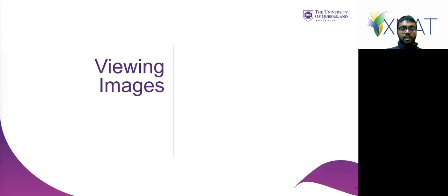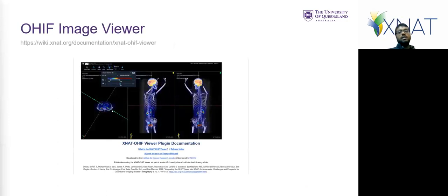Okay, so next we'll have a look at viewing images. The key thing we're going to talk about is the OHIF image viewer. AIS XNAT instances come with the XNAT OHIF image viewer, which is a plugin developed by the Institute of Cancer Research in London. Just note, if your publication uses this viewer, they have an article for citation. The link above will have all the information about this.